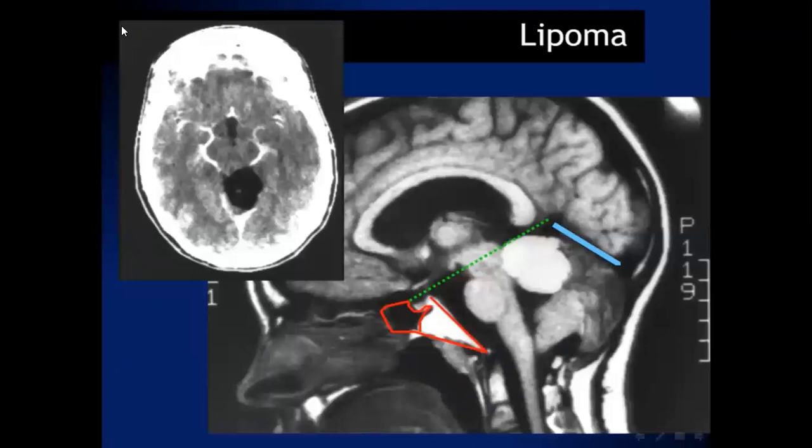Another diagnosis is lipoma. Axial CT shows an area with fat attenuation posterior to the third ventricle, and the sagittal MRI shows a fat signal intensity region located below the line of the tentorium, between the straight sinus and anterior clinoid process. This is a case of lipoma, which compresses the posterior fossa region and cerebral aqueduct of Sylvius and causes hydrocephalus like pineal gland tumor.